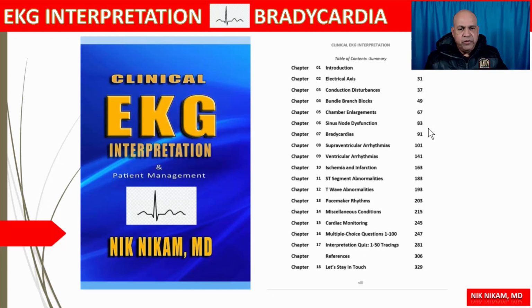In this presentation, we're going to be looking at the sinus node dysfunction and bradycardia.